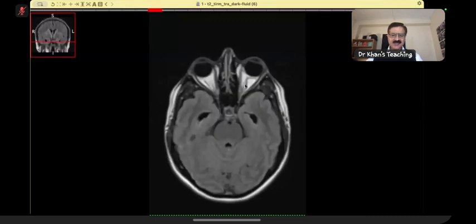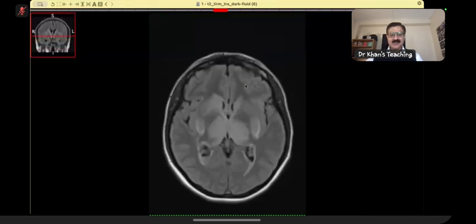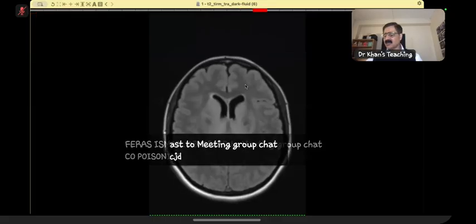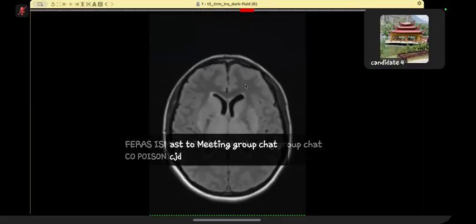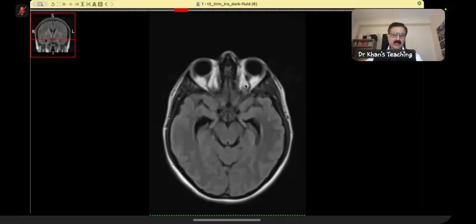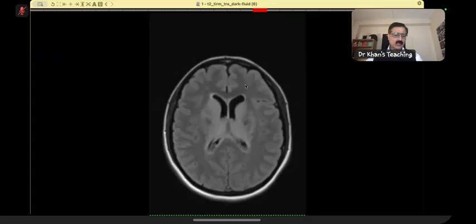Excellent. So this is a very interesting thing: the eye sees what the mind knows. Had I shown you a CT, you would have picked it up. It is as simple as that. This is dural venous sinus thrombosis.